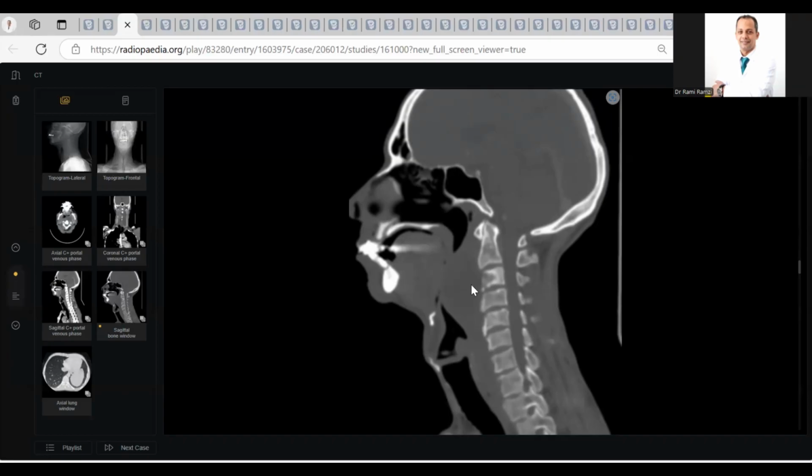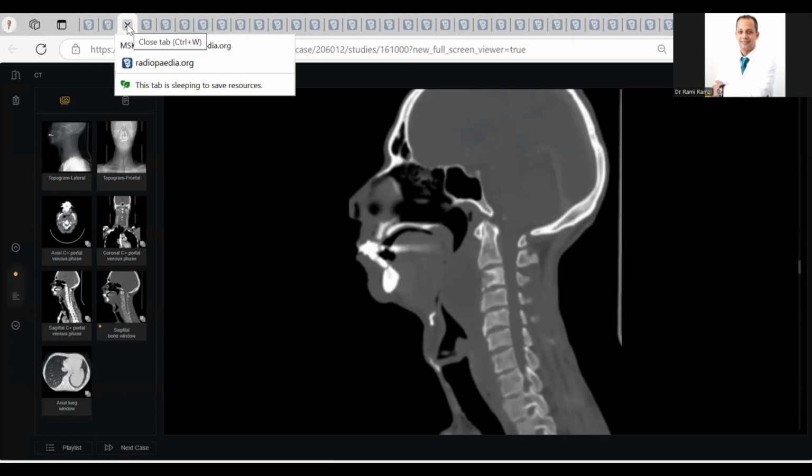This is the template of a TB patient. My colleagues, you must meet one TB case in your exam. You must. Why? Because it is very common and it is a radiology task.